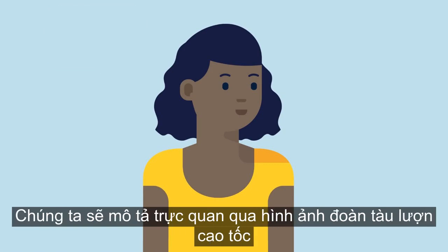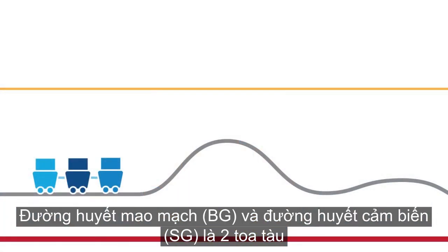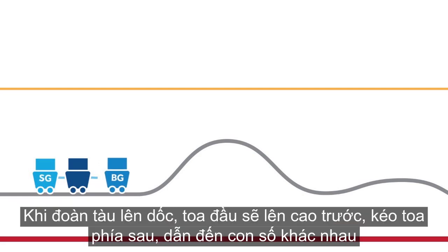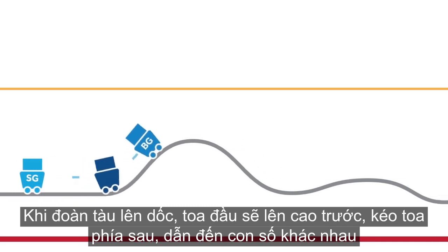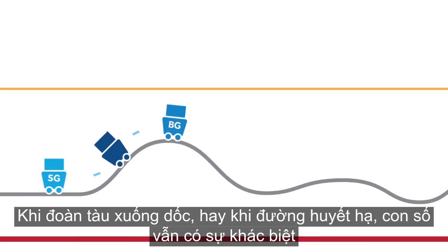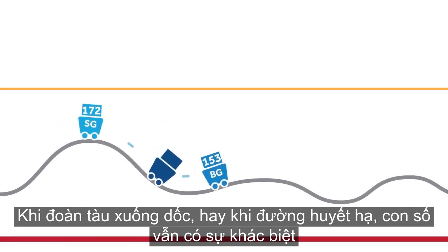Let's see how a roller coaster can help illustrate this. Picture your blood glucose and sensor glucose as cars on a roller coaster. The front car will be your BG, and the back car will be your sensor glucose, or SG. As the roller coaster starts up the hill, you can see that the BG in the front car is leading the SG in the back car, and the numbers are different. As the cars head down the hill, or as glucose is trending down, you can see the numbers are still different.